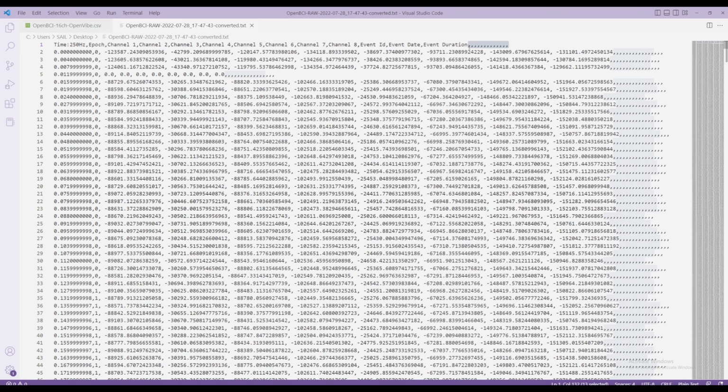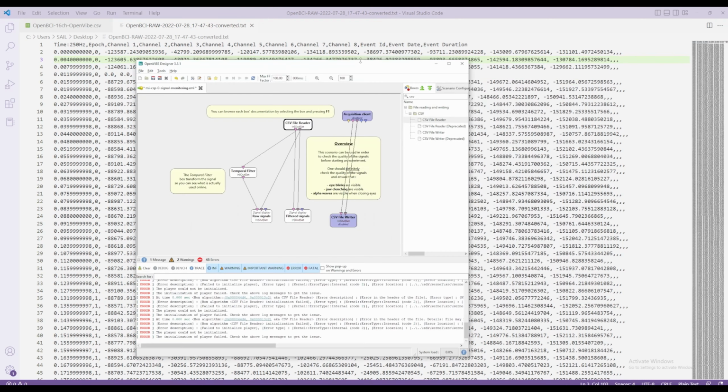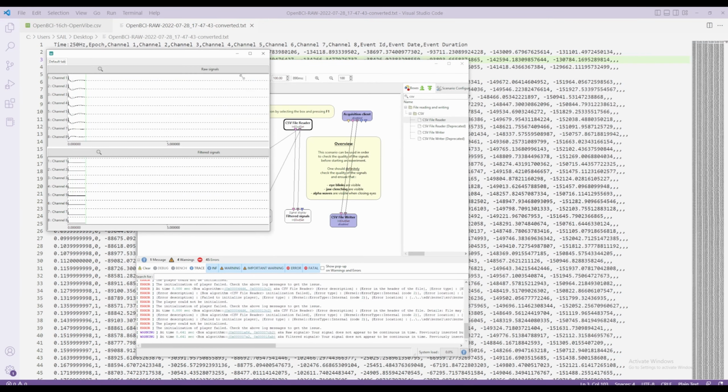So I think, well, if I find this, we can replace it with nothing. There we go. Still have these left, 3 extra ones, because these are the 3 empty columns. So this should be okay now. There we go.